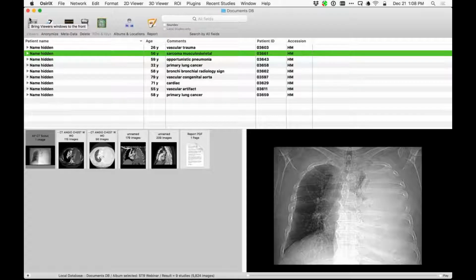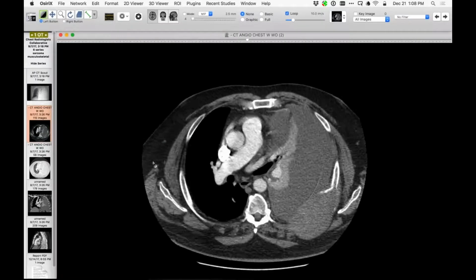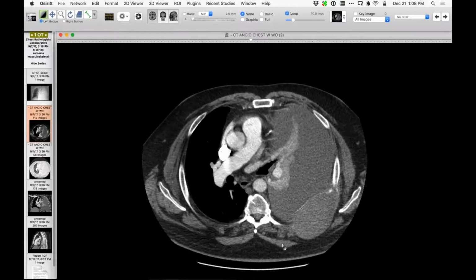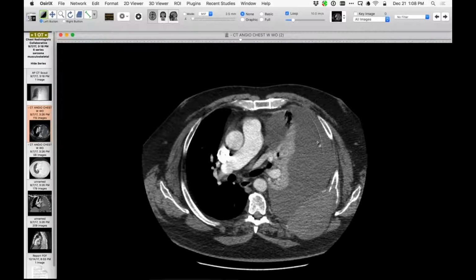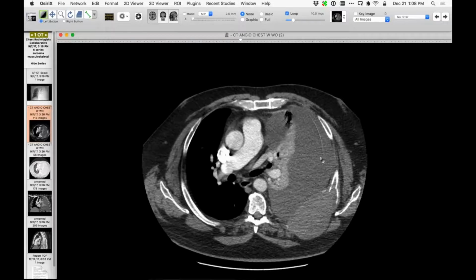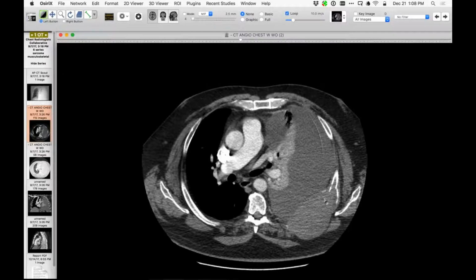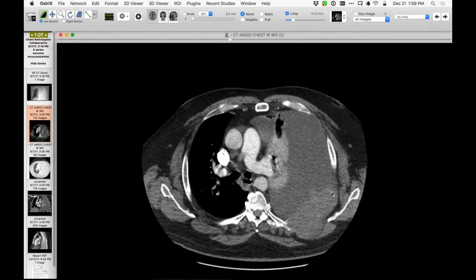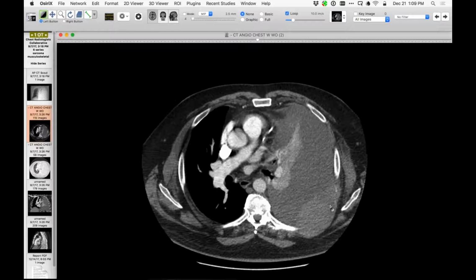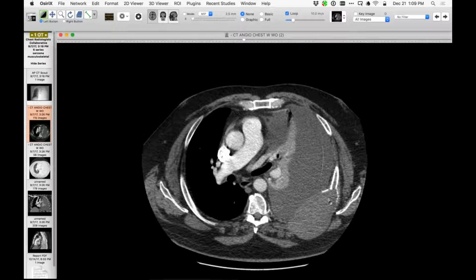Hey, Howard, for the trainees watching, that case also has a nice example of a detector artifact from the CT. You can see that little... yes, right there. Yeah, that ring artifact. I can't remember the genesis of it exactly. Yeah, it's somehow related to detectors. Right, and it's usually because one of the detectors has gone bad, and that's why it moves around depending on where the image interpolation was done. So, that's a good one to recognize in practice, but also a good one for exams and other quizzes. Yep, good.